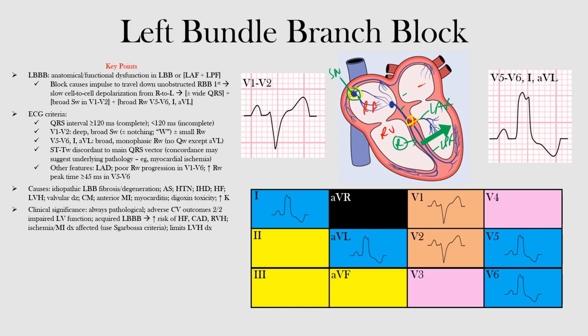Remember, when we talk about premature ventricular contractions, or PVCs, this results in a wide QRS complex as well. The difference here is that the PVCs are aberrantly conducted right from their start, right from the origin in one of the ventricles. That's when we see the problems occurring. However, with the bundle branch block, you have normal conduction right from the start of the impulse until it hits that block. It is the initial component that gives bundle branch blocks two main appearances with minor variations. And that's where we get the right and left bundle branch block patterns. Here, our focus is the left bundle branch block pattern.